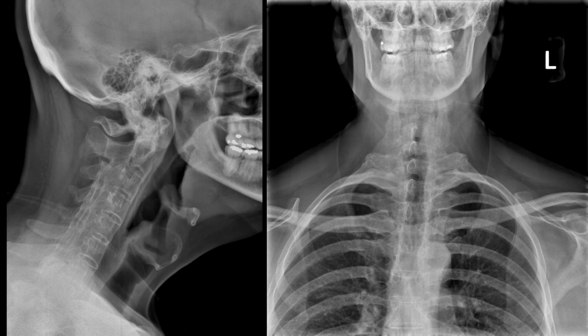Cervical and lumbar x-rays were obtained on this patient. We'll start with the cervical views, and I'll give you a second to look at these images and then zoom in to the major radiographic findings.